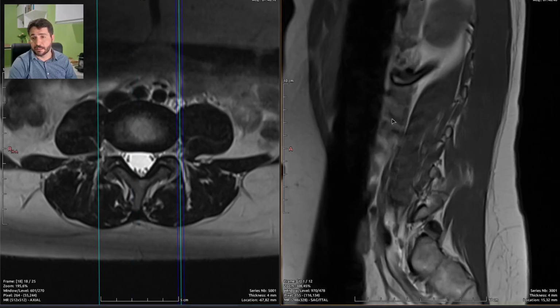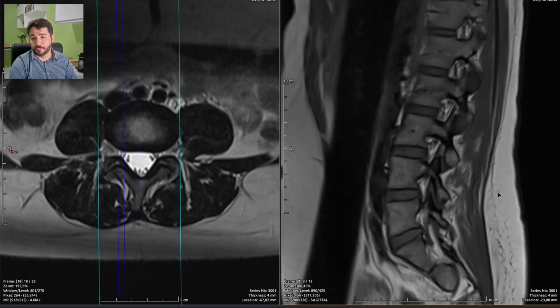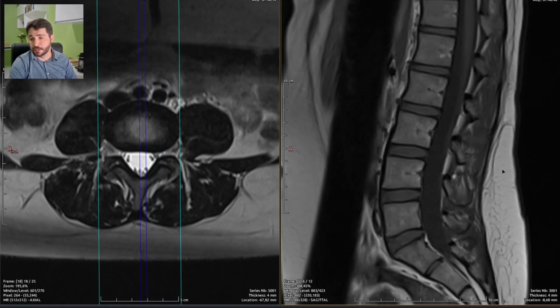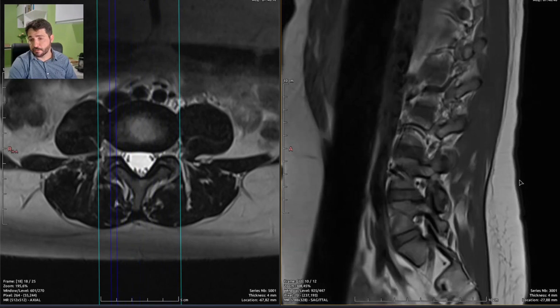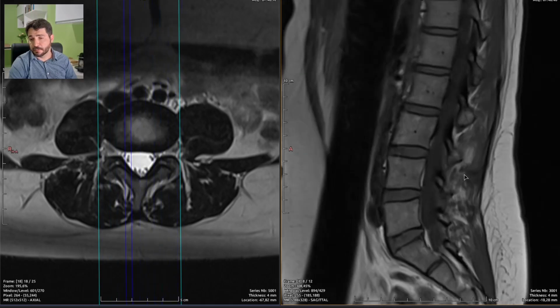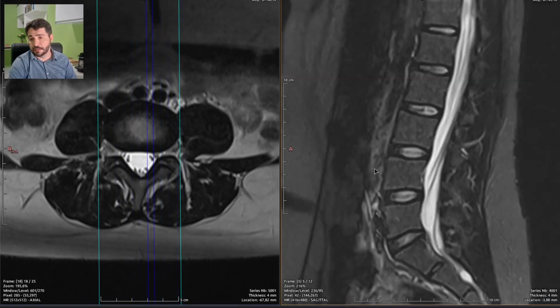So let's get a T1. T1 is bright fat, low signal, liquid fluid. So this is a T1. It is great to see bone and morphology and arthrosis and nerve root surrounded by fat. So this is really fine. This is awesome. No signs of disease.